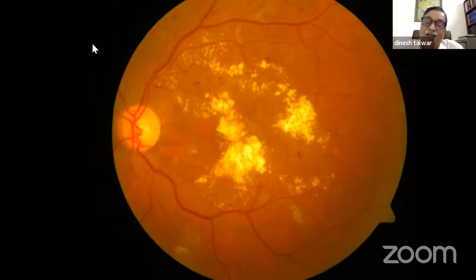But central serous retinopathy is the hint that Gopal was giving you, and it is correct. But what about a condition in which some 3 million procedures are done every year? Many of those patients get macular edema. CME, post-operative CME. Yes. Okay. They don't get hard exudate.